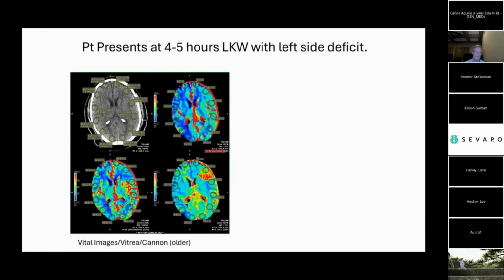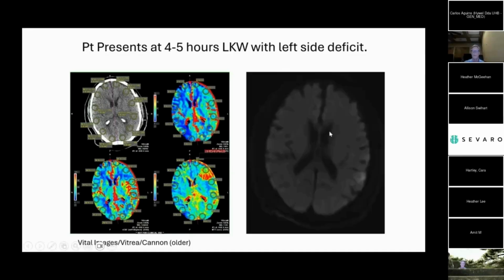This is a case where we thought we saw some clots at the M2 and M3 segments. So I went ahead and ran a catheter up and gave them intraarterial TPA, and this is a diffusion weighted exam the next day. Again, this should be a stroke if it completed. Since we were able to open up the vessel, we were able to restore the blood. This person is perfectly fine there. This back here, I couldn't open up. This is core. By the way, the patient had no symptoms after we treated him.